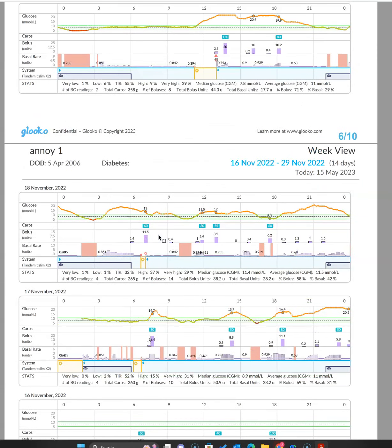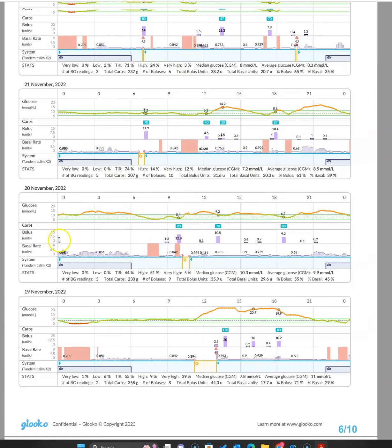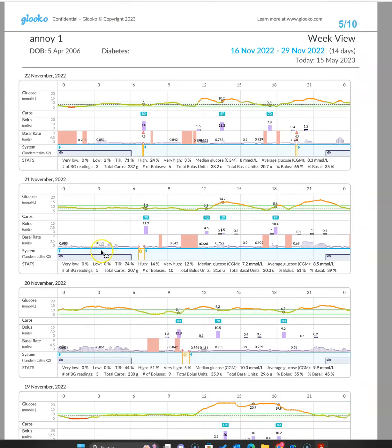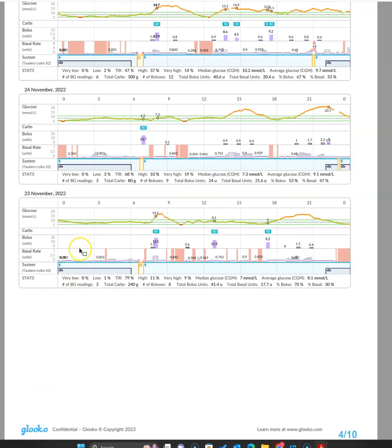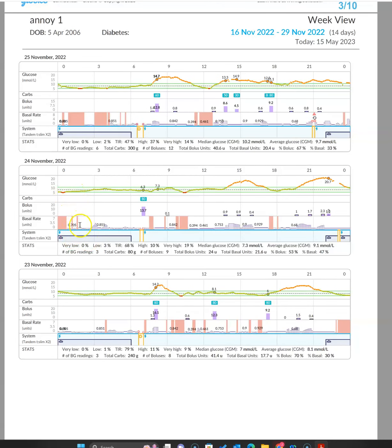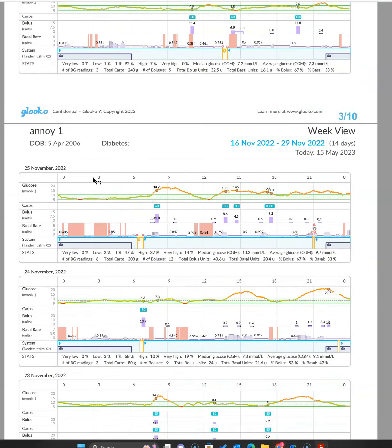Do the basal rates seem adequate overall? Is there a lot of extra insulin going in overnight? So here we've got a few examples where the glucose level is in target and it stayed in target all night here. There's quite a bit of extra basal that's been pushed in, and certainly on that night there. There's a little bit extra there, there's a few suspensions. Some extra going in there. Few suspensions, but some extra. So maybe, maybe not. There's a bit of a mixed bag.